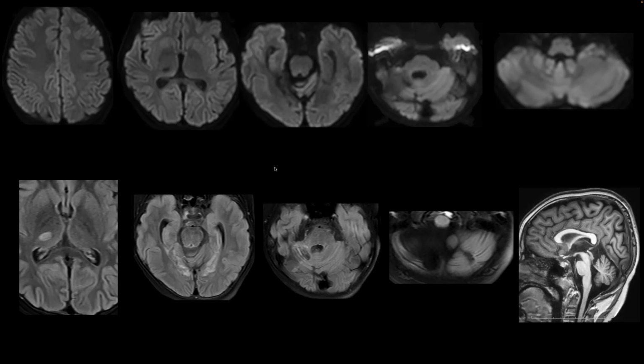That's just a thought. Yeah, but the child is also developing symptoms. Is getting strokes. So I would just evaluate it, Kavita, just to rule out. No, but I'm just talking about the enhancement. I think you look at the stroke, but if you have persistent enhancement of a lesion, you don't look at it as active necessarily. Yeah. No, actually, we are not getting persistent enhancement. We are getting irregular enhancement of some part in one scan, the other part in the other scan, like that. So it is not even persistent, and we are not able to explain that.